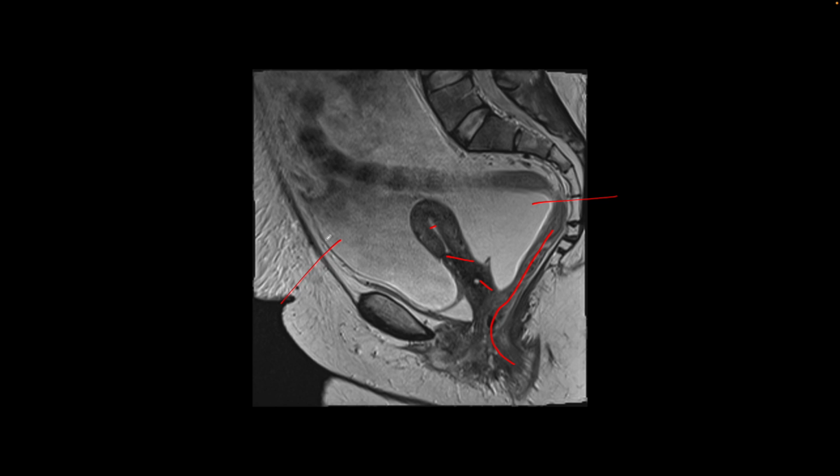And the interesting or the teaching aspect of this case is when the abdominal cavity is distended with fluid, you can look at and visualize peritoneal reflections better. So here we are looking at the peritoneum coming down like this line, and then it reflects off the urinary bladder, covers the anterior aspect of the uterus, goes down, and from here it goes this way, covering the anterior aspect of the rectum.